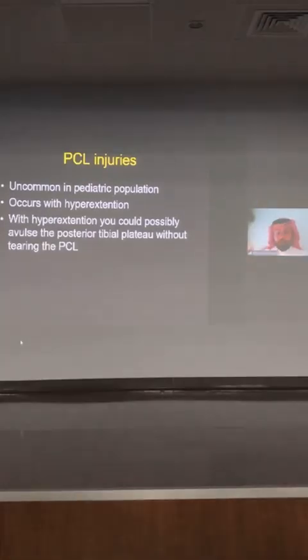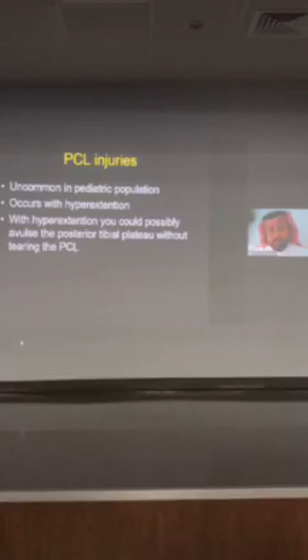Then look at the MRI and look for the ACL, look for the anterior tibial translation, look if there's uncovering of the posterior horn of the lateral meniscus and the bone marrow edema pattern, and then come up with a conclusion whether there is an anterior cruciate ligament injury or not.